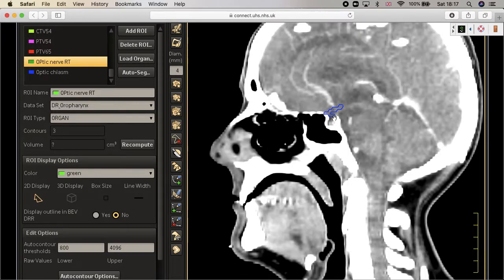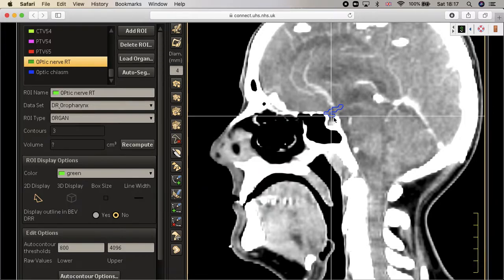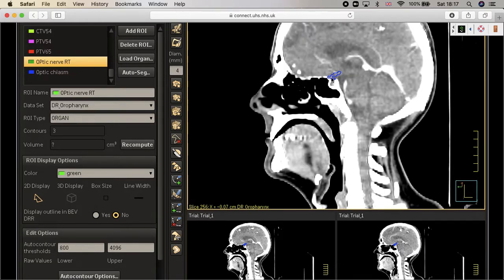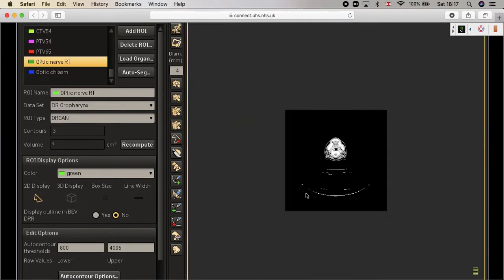So I can see something wrong there. As you can see, maybe I did something wrong there. It shouldn't have any tail above or at the level of the suprasellar region. So let's go back and see what's wrong there. Okay, let's put it like that and see what was wrong there. It should be like a straight line, suprasellar, directed posterior and upward. It shouldn't have any tails like that. Let's see what we did. Okay, good. Maximize.